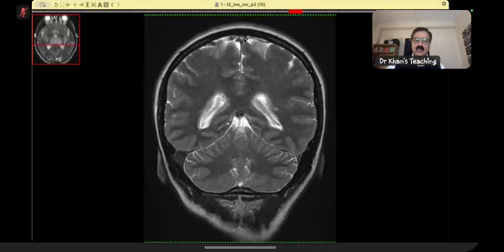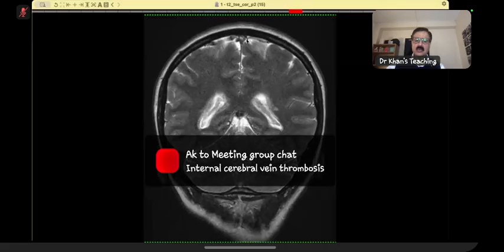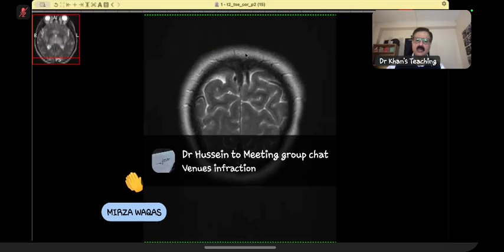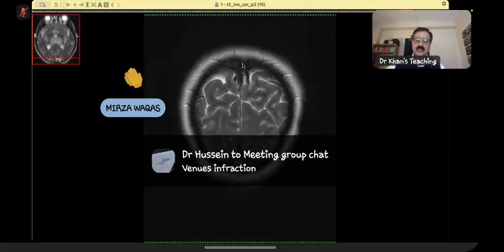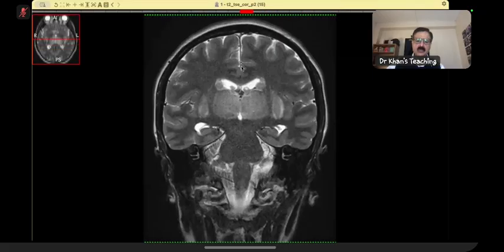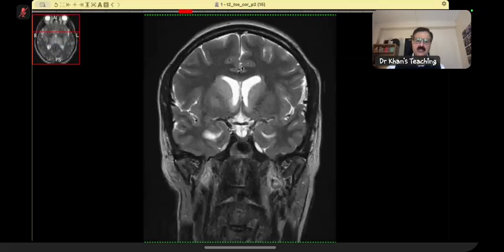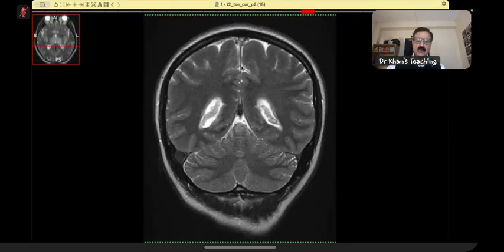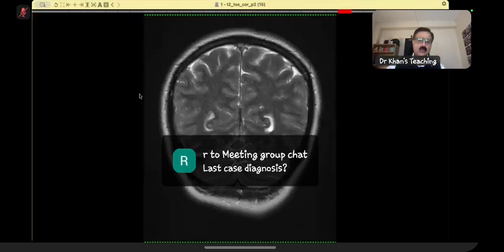And these are the cortical veins which are thrombosed. That is why this cortical vein was high signal on the FLAIR. And as I'm going back, you can actually pick it up, two plus two. I'm not saying that you should pick up on a T2, but you should develop your eyes. This is the importance of "I see what the mind knows", and developing your eyes to pick up subtle findings on available sequences to help you.